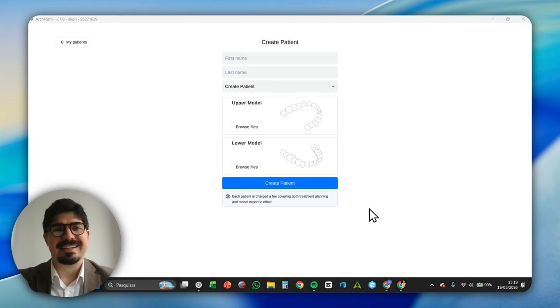Hello my friends, in this video I want to show you how to start with Archform and how quick you can start planning your cases.